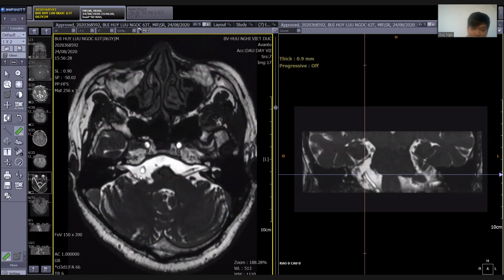Hello, can you show me more clearly? Because to be honest, we are just a newbie in this topic. Where is the cranial nerve and where is the blood vessel? Can you point the arrow in this? Okay, what is it?